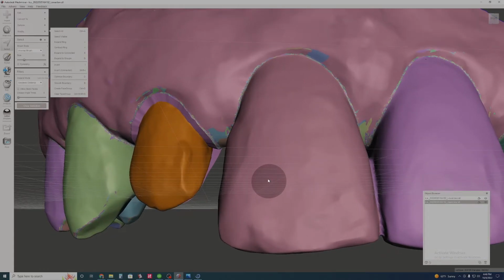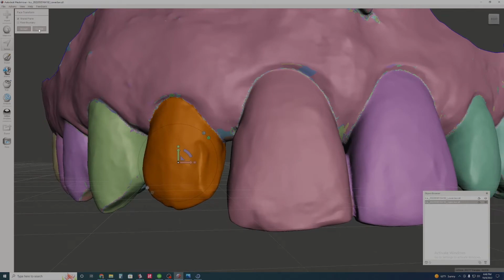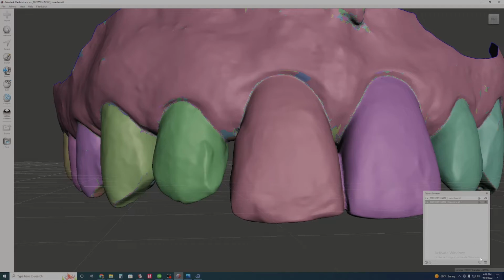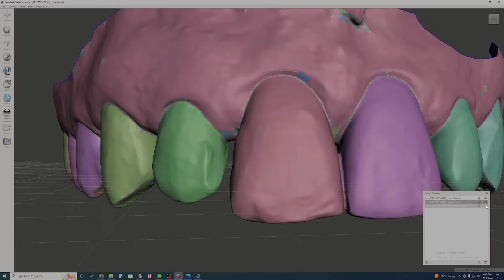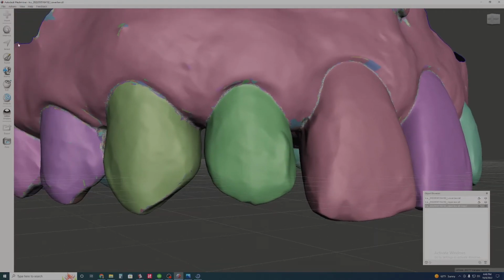You know, one thing that I might want to do actually is I'm going to reverse all this. I am going to cancel that, and I'm going to make a copy of this. I'm going to go over here. There's a button down here for duplicate. I want to have a duplicate to compare to. In fact, we're going to make the preps on the duplicate.